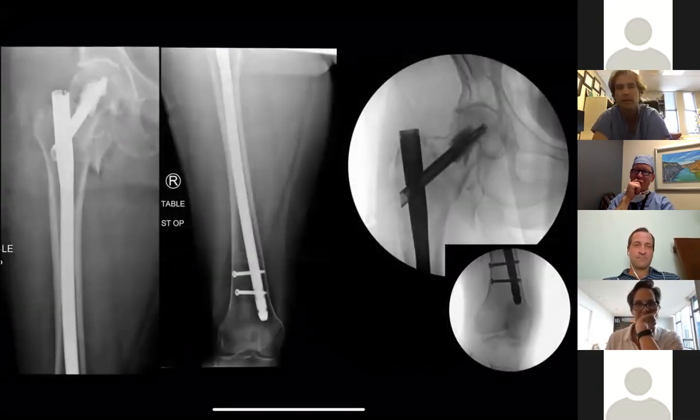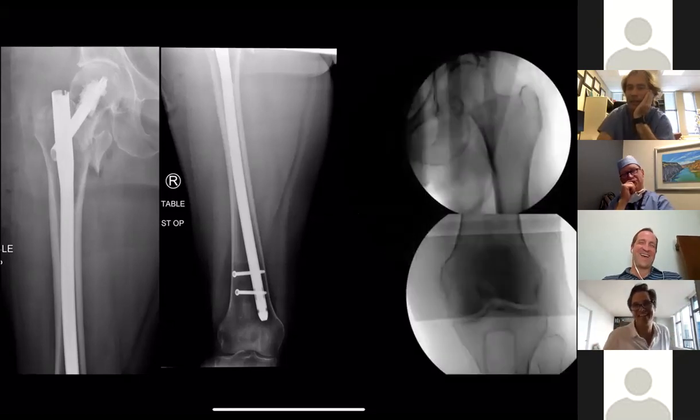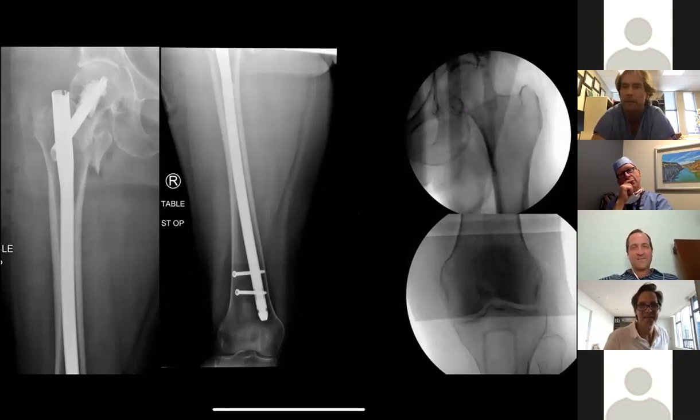So this is the post-op X-ray, AP. So now it looks like the proximal fragment is externally rotated compared to a pure AP of the knee based on the contralateral side, right? And if you look at the intraoperative films, it looks like you've got internal rotation of the limb in order to get the AP X-ray that you needed. Interesting. Crazy. I mean, interesting in a you suck kind of way, but right? And if you look at this and compare it to the contralateral side, you can see it's different. Something's wrong, right?